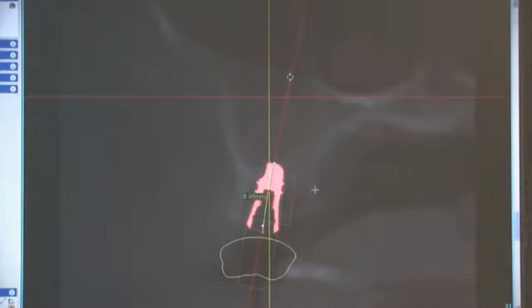We have great buccal lingual width, and we have adequate mesial and distal width. Our concern is our height of bone that we need to work with. So again, using the software, we're able to determine that we do have adequate bone to place the proper implant in the proper position.